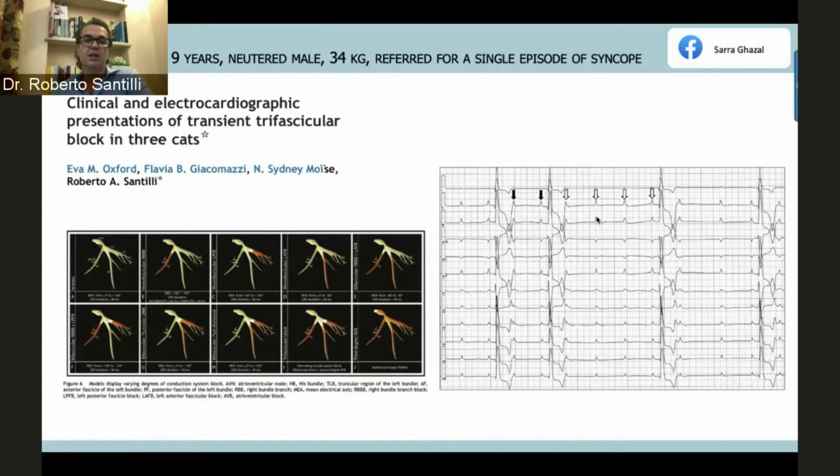So it looks like hypertrophic cardiomyopathy, but it's just edema. And then within 1 month, usually you have a normal conduction, so that you can actually see a disappearance of the AV block, and also a remodeling back to a normal thickening of the left ventricular wall because the edema disappeared. So this was a very interesting ECG.